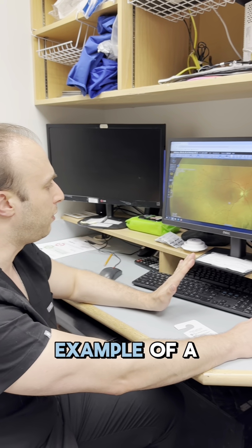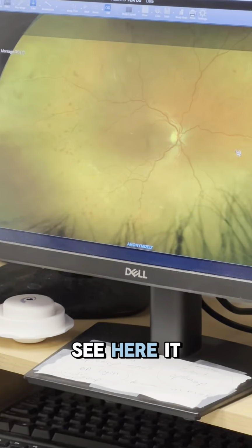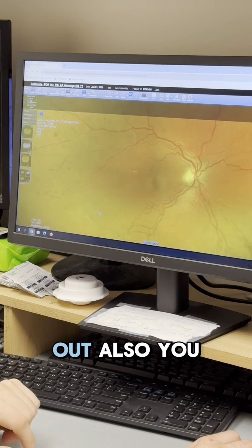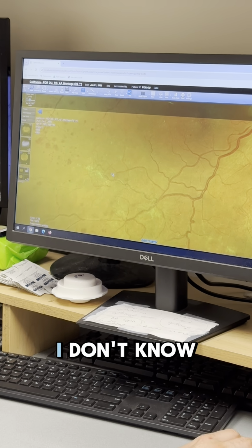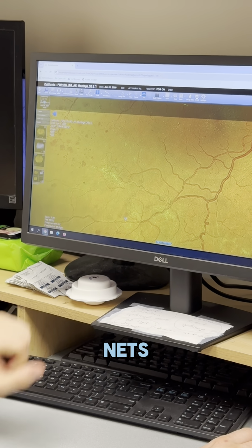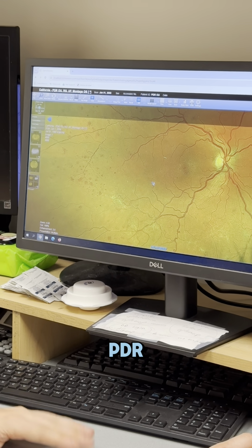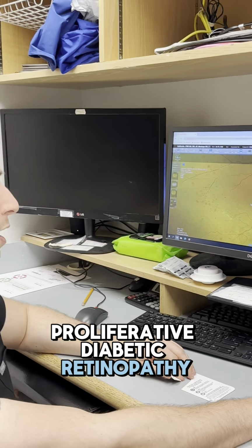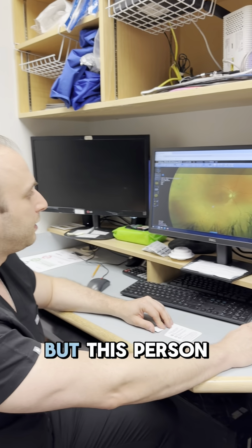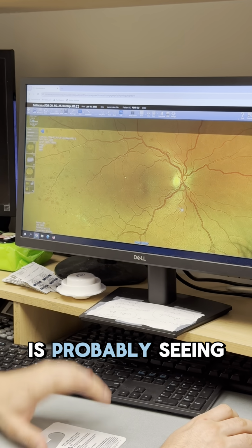So here's an example of a person with diabetes. As you can see here, it looks really bad. There's a lot of blood leaking out. Also, I don't know if you would be able to appreciate it, but there are these little collateral neovascular nets, okay? So when I look at this, this person has PDR, which is called proliferative diabetic retinopathy, meaning that they created bad blood vessels.